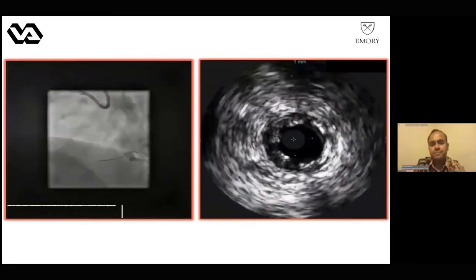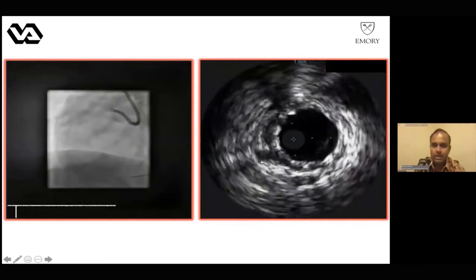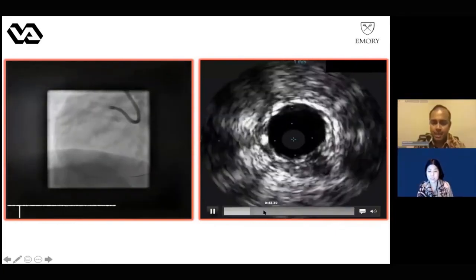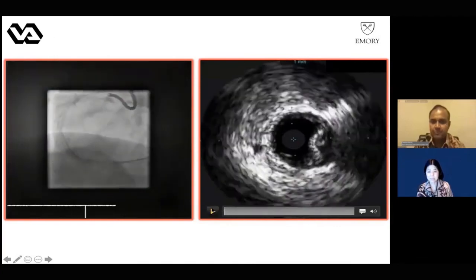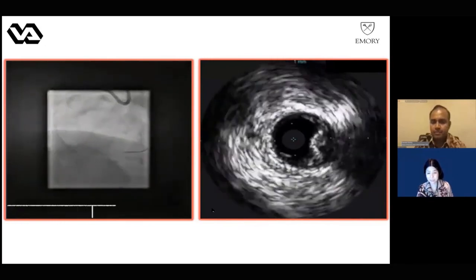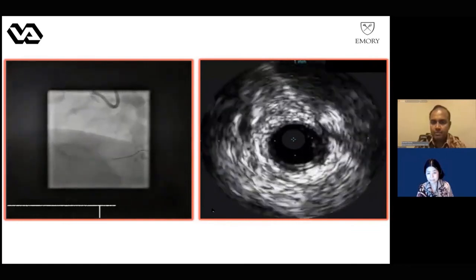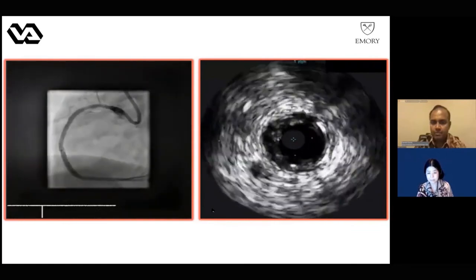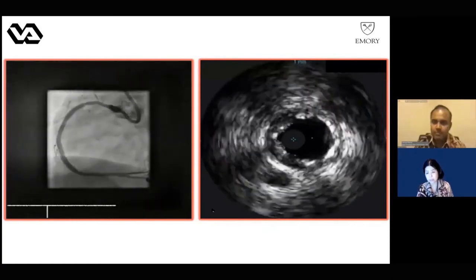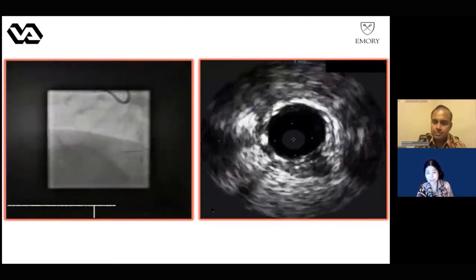Sure. Okay, let me request remote control. I do remote. Okay, so I think there is not much explanation. So you see from the beginning again. This is distal to the stent. You see a little bit of nodular calcification, but that's okay because the lumen is good enough. And then this is a relatively normal segment. First, you have to check there is no edge dissection. There is no dissection, that's good. And then you see the old stent.